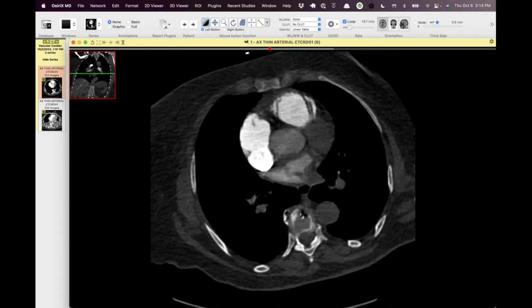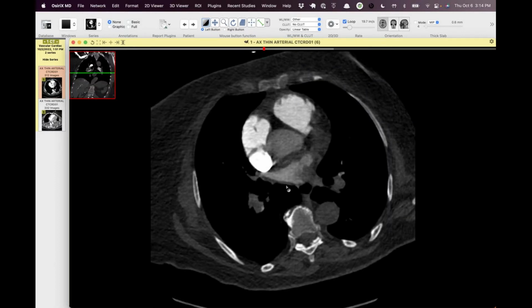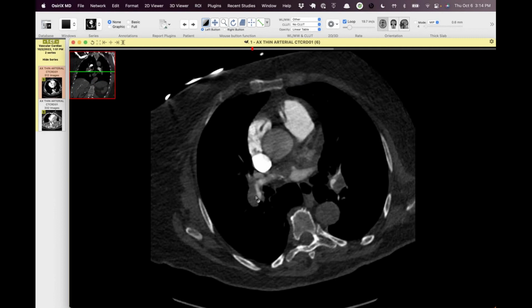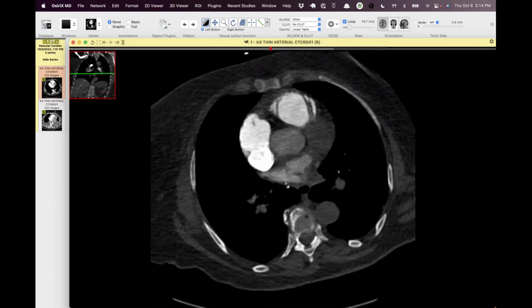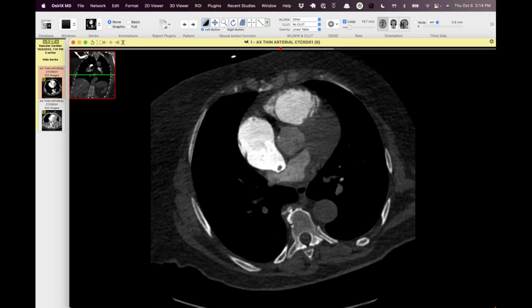And this patient had not had stroke symptoms. And the question is, what do you do with this? We do a lot of mechanical thrombectomy and whatever this new vacuum assisted device is for sucking out clots. I don't know what they do in the left side. And this patient actually had other issues as well. They had a GI bleed. So it was a sticky situation, but I can MPR this really quick here too.